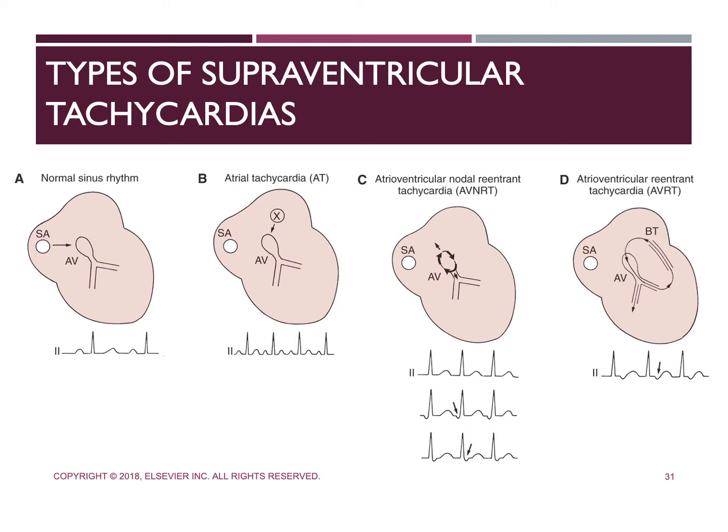And what happens when this occurs is the P wave may be buried in the QRS complex, or it might even appear immediately before or just after the QRS complex, because basically the atria and the ventricles are being activated simultaneously, or at the same time. So you'll see there's arrows here that show that it's being buried either within the QRS or directly before or directly after. We're not seeing that upright P wave.